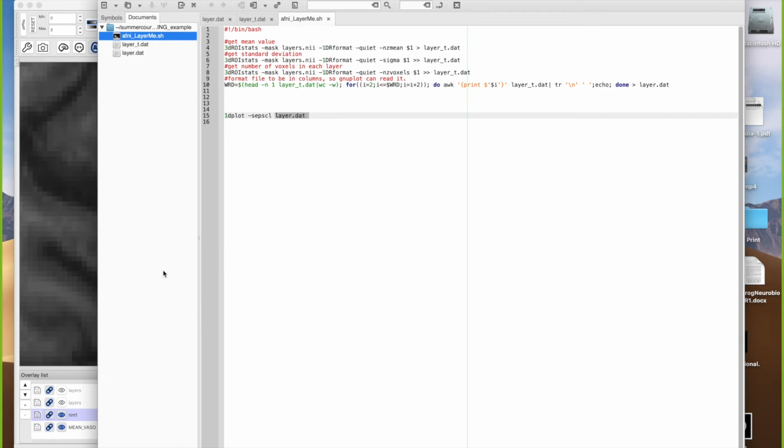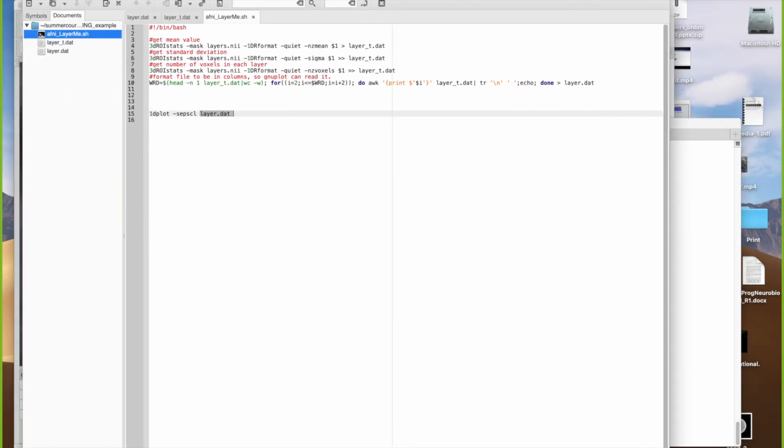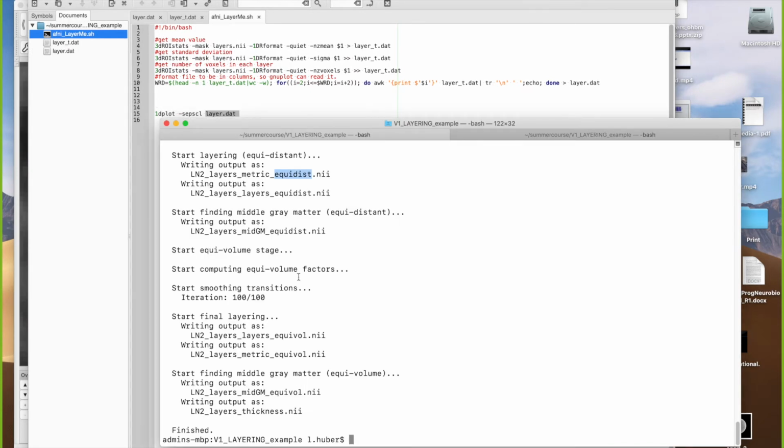And where is my terminal? And there's a reason for it, but I think we don't need to discuss it here. Importantly, he writes out layers as a file with the prefix that we had as output. So our LAYNII file, however, expects the mask to be named layers.nii.